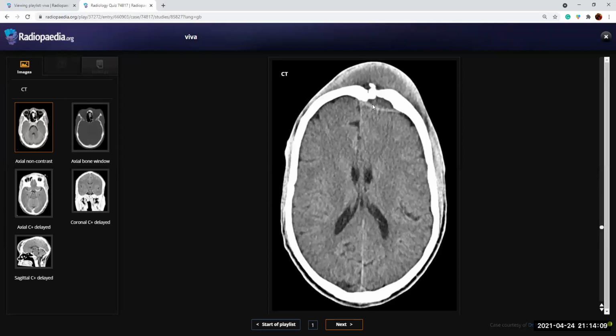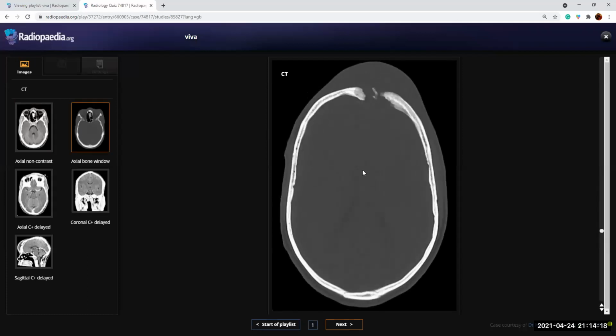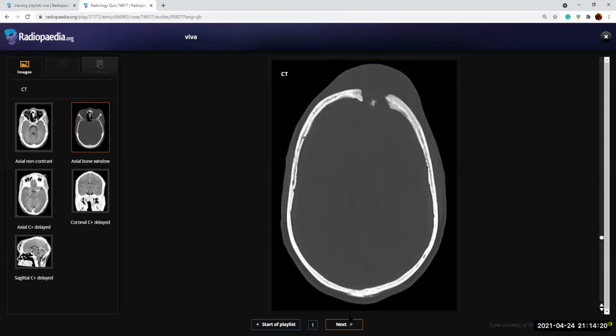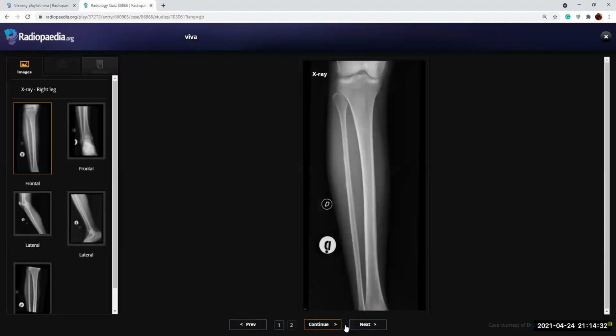You're seeing there is an extradural collection and an extra-axial, extra subcutaneous collection. So you got that right. That was completely right. But in the current picture, we are not seeing any features of sinusitis. So this was totally okay. End the case when you have got it right, but you have to wrap it up. You have to take it somewhere. You can't just keep it. Actually, you wasted a lot of time.